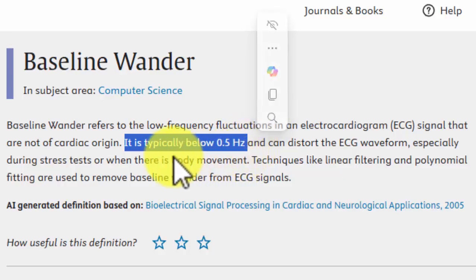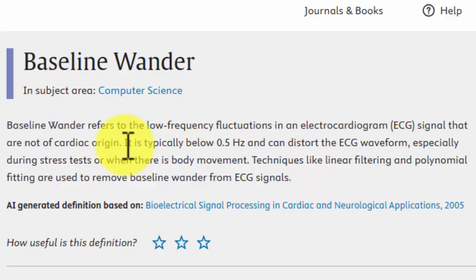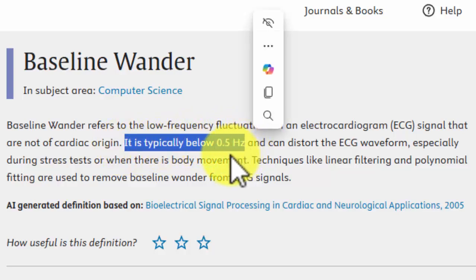Basically you can also use a Butterworth filter, which we did in our previous tutorial, where we removed the baseline wander using a Butterworth filter. But the problem is that Butterworth sometimes introduces morphological changes in our original ECG signal. So what we do, we look for different techniques which keep the morphology of the ECG intact. One of these techniques is the wavelet denoising technique, which we are discussing in this tutorial.